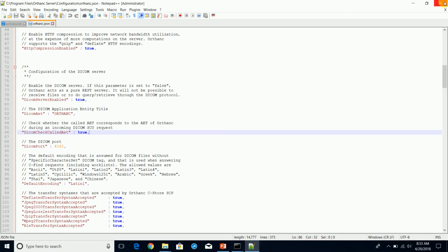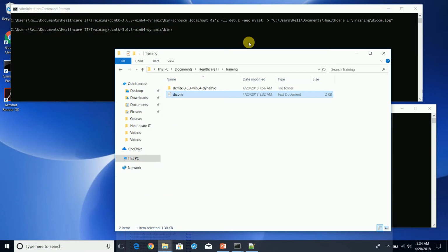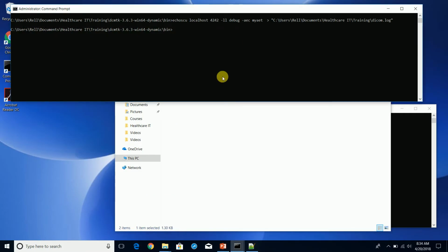So in this case, we have to specify the calling AE. Let's give ourselves a different AE title that we're actually calling from. So let's do -aet.